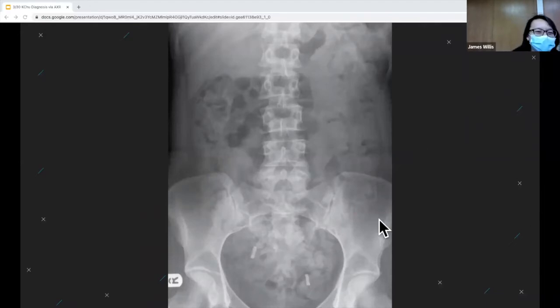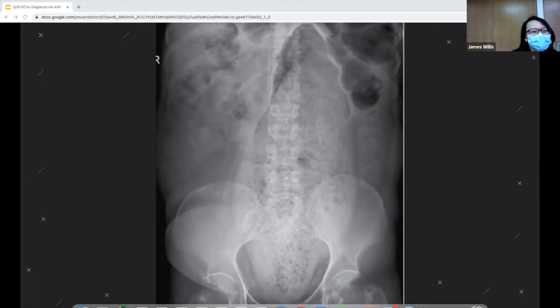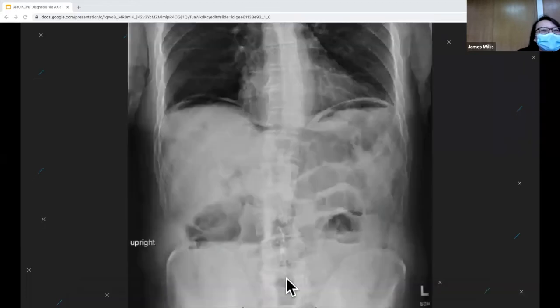Yeah, they're still everywhere. There's a lot of fecal loading here. This is constipation. Okay, Christina. Correct. So there's a lot of stool here. This is fecal impaction. There's a lot of fecal load. Yes, this is really bad constipation. They need a disimpaction plus more. Okay. MJ.